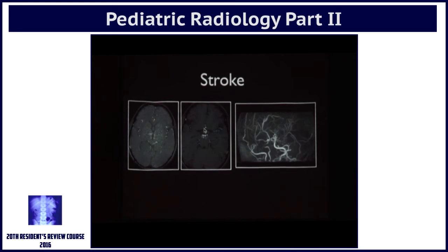Now, moya moya would be something which even the clinician sort of suspected because there were multiple episodes of strokes. So what we are doing the MR angio for is to look for the size or the caliber of the middle cerebral artery, so that the surgeon, this is managed neurosurgically, can go ahead and do a STA to MCA bypass. So superficial temporal artery to MCA bypass.